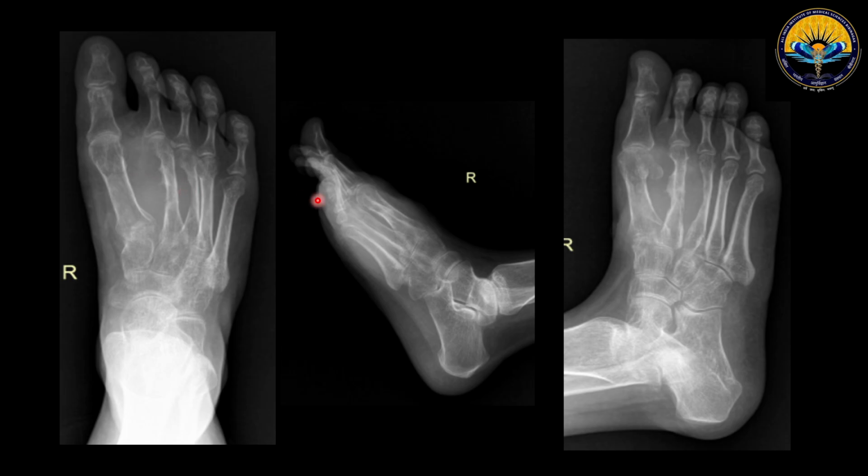The soft tissue doesn't show any calcification within. However, it is scalloping the third metatarsal head and showing a benign type of periosteal reaction along the medial aspect of the body of the second metatarsal, and we can see here also on the base of the first metatarsal a benign solid periosteal reaction.